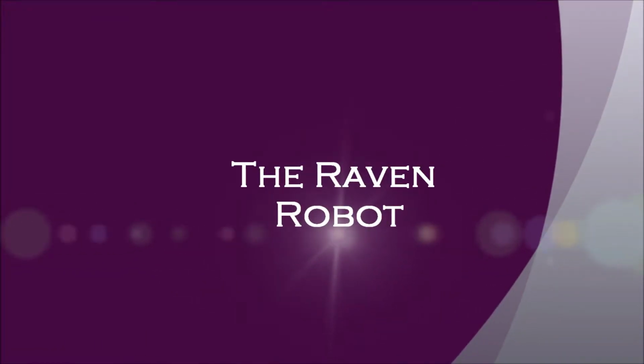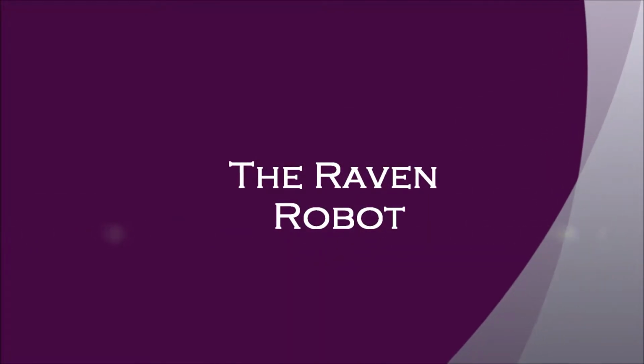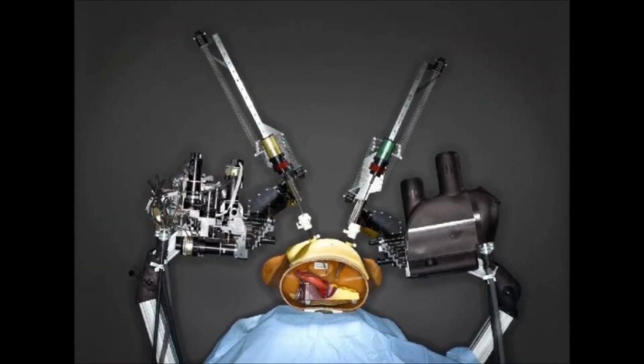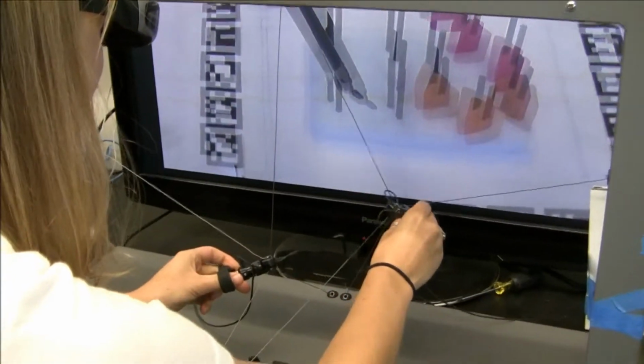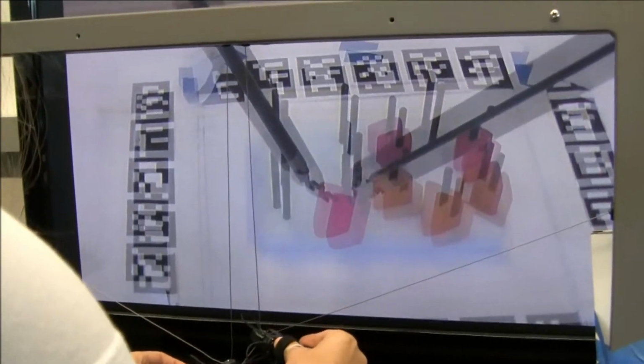Welcome to the training module for the Raven Surgical Robot System. Through this module, you will learn the background, structure, and components of the Raven robot, as well as how to utilize them. First, let's begin with a brief history of the development of the robot.